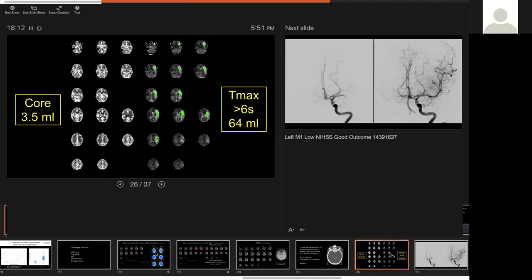So let's take a look at what she's got at risk. And again, even though this is a mild NIH stroke, there's a lot of pretty important brain tissue that's in the green zone there. So we're worried about this. On the other hand, if we have a low NIH score patient, particularly if it's an M2 occlusion, and the green region is very small, then you have to say, look, I'm looking at what's going to be a small infarct. And do I want to take a risk of rupturing that M2, right? So this is a case where we decided we want to go after it, right? This is actually a distal M1 rather than an M2, and there's a substantial mismatch.